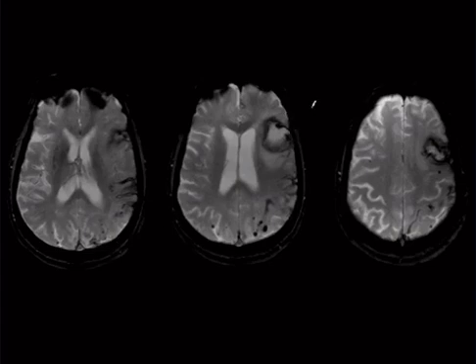Remember I said that you can have a presentation of amyloid that has a big lobar hemorrhage, but they will have to tell you that the patient does not have hypertension, and they would have to prove to you that they didn't have an underlying mass by showing you post-contrast imaging. Be careful with that because a hematoma can enhance potentially, but it shouldn't enhance like a mass. You should be able to tell the difference.